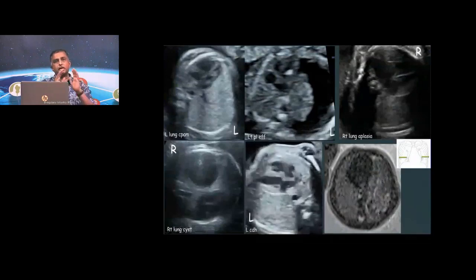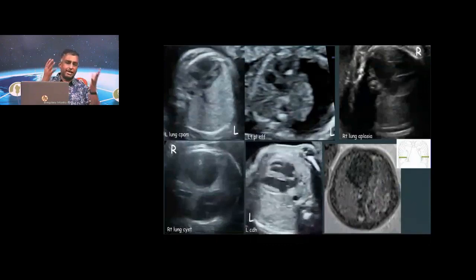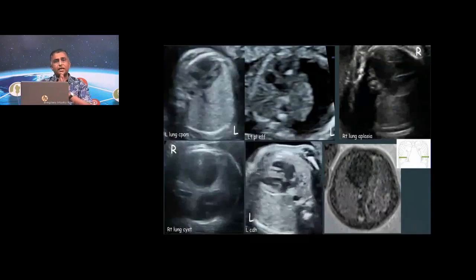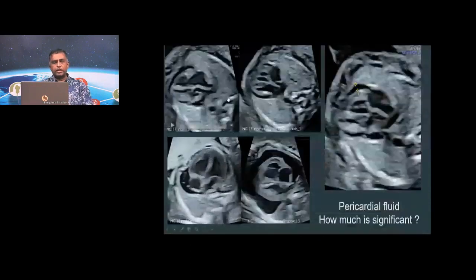So oftentimes, especially when there's a right-sided diaphragmatic hernia, or when there's only bowel left-sided hernia, the mediastinal shift is the one which gives you the headway clue, and building on this clue, you can reach your final diagnosis, right?